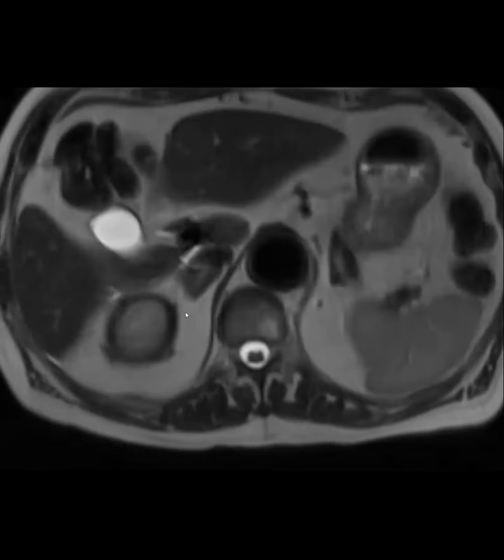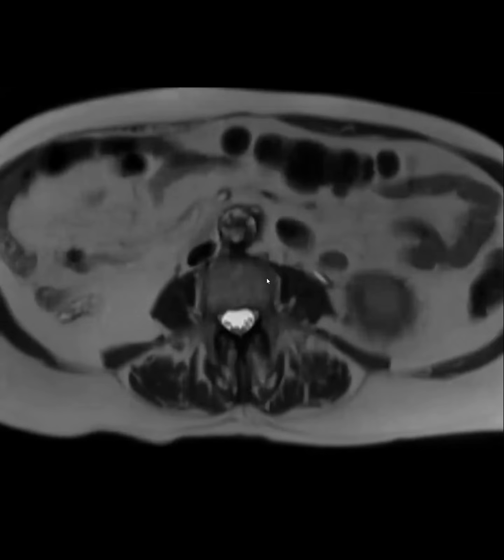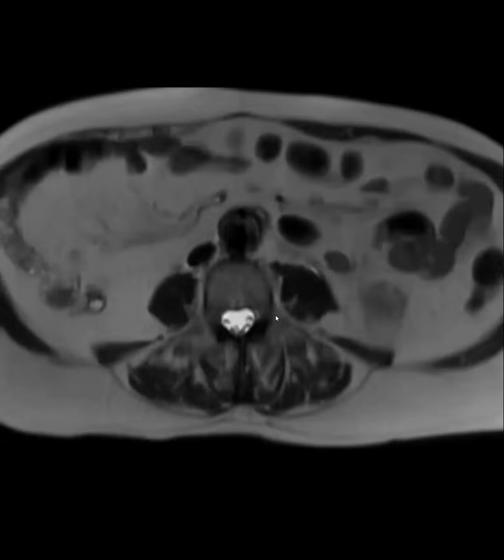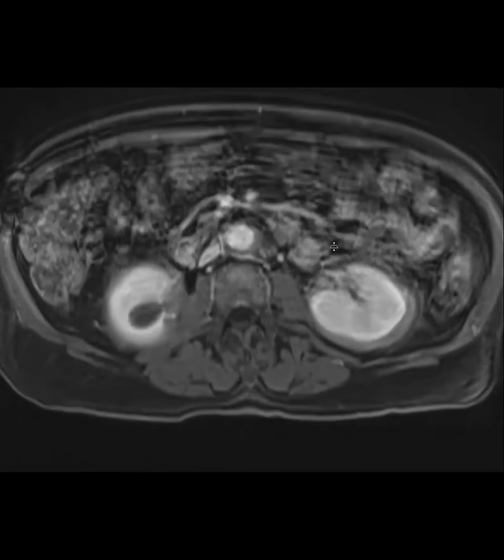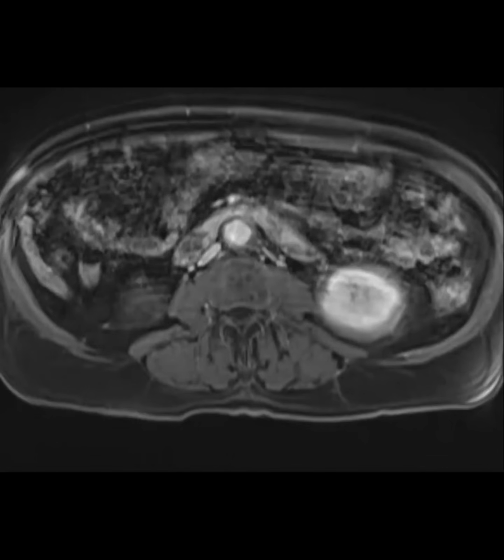There's also something around the adrenal glands. And then there's a similar T2 dark thing around the aorta here. And I'll show you a post contrast. Yeah, interesting. I mean, this doesn't really help. It's a lot of findings, but anyway, I will just cut to the chase. The patient also had orbital swelling.